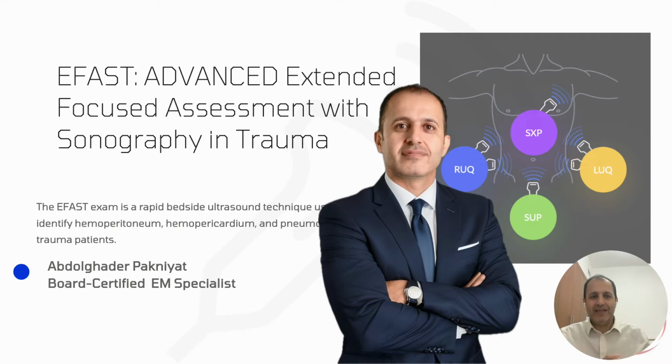Before discussing the EFAST, extended focused assessment with sonography in trauma, let's have a very quick and short review on the basic ultrasound and physics of ultrasound. It's very important to be familiar. Otherwise, we cannot adjust the settings to have high quality images with good resolution. And in these cases, if you don't do the adjustment properly, there is a chance of misinterpretation, a chance of missing some pathologic things, and we will face lots of artifacts. So it's very important to adjust the ultrasound properly.